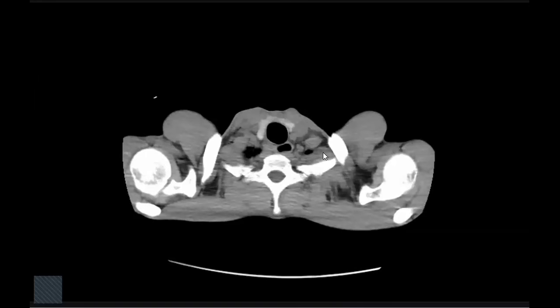Okay. In the mediastinal window. Sorry, yes. Hold. Yeah.